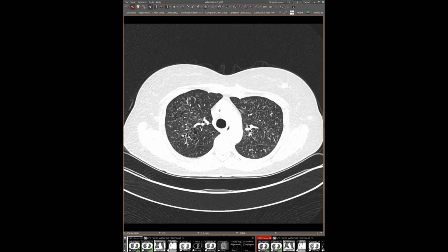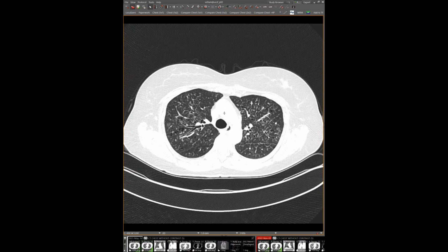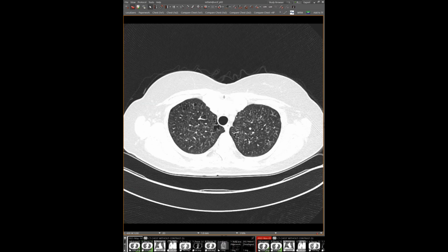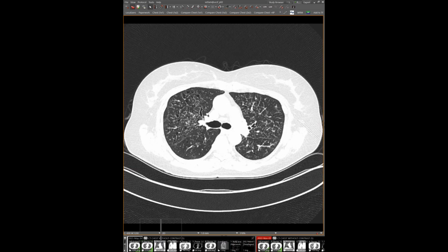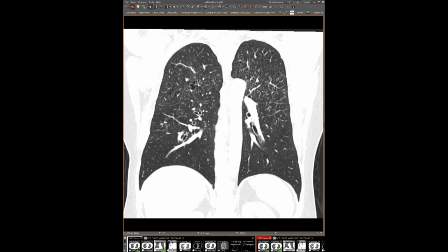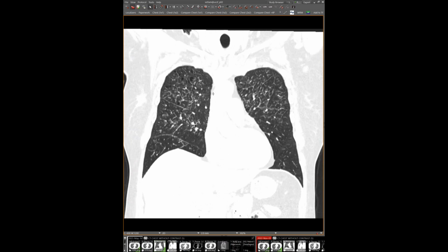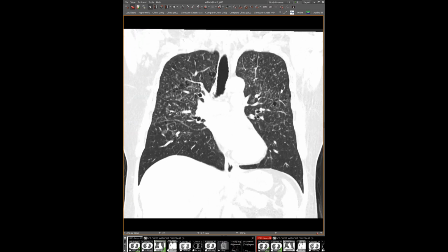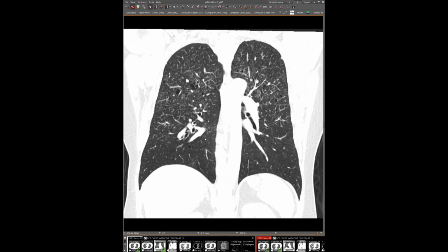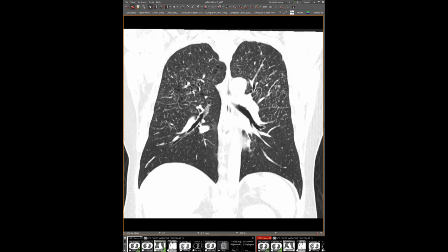Excellent. Which again is just not a pattern that I have seen before, but this seems like what can explain it. Yeah, definitely. It's interesting that it's so strikingly upper zone. It sort of fades out at the bases. Yeah, great. I think there are some reported cases of septal amyloidosis that are upper lung predominant. So normally we think of amyloid, but the nodular pattern seems to be worse in the bases, but the interstitial form doesn't have to be in the bases. Yeah, that's cool. That's just a very cool case of something I've not seen before. Light chains, I know, right?